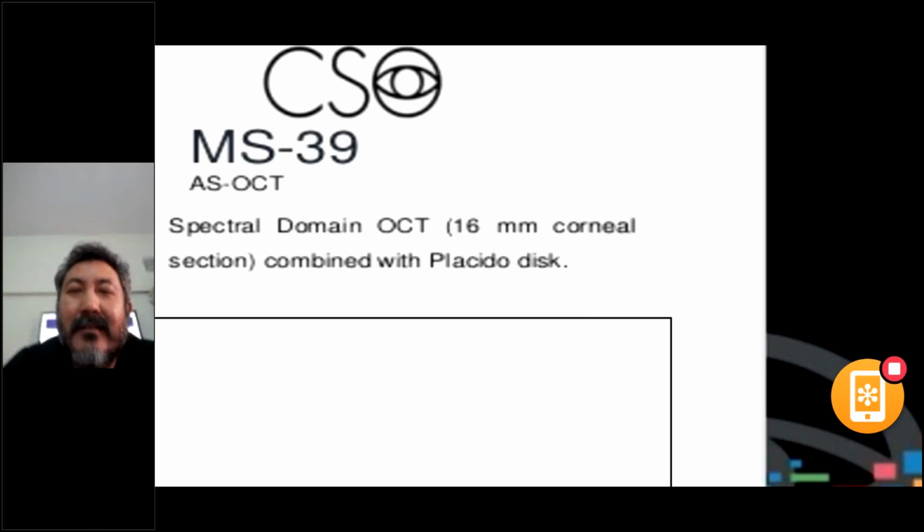I guess it also has a meibography technique, right, sir? Yes, which we'll be doing in some other topic. It tells you the amount of meibomian glands and ducts that are destroyed, and the quality of your tears. The percentage of destroyed meibomian glands and the percentage of destroyed mucus gland, it shows all of that.